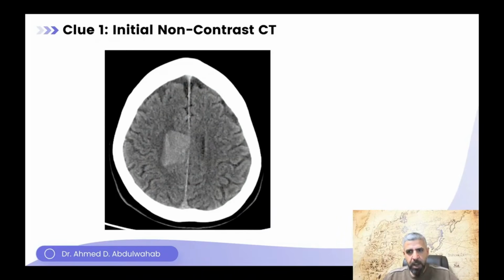Is this a bleed? On CT, an acute bleed that's less than 1 day old should be bright white, blood density, hemorrhage density. This isn't white. It's slightly dense. An acute bleed should not be like that. So why isn't this patient bleeding brightly? Bleed or no bleed? What do you think? What do we do? What's your next step? Your next clue? What will you think of?